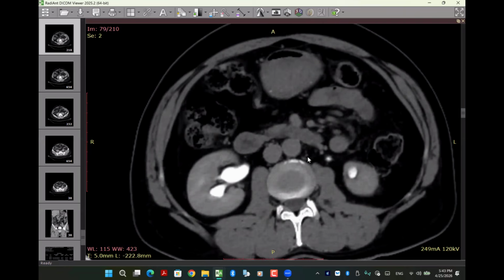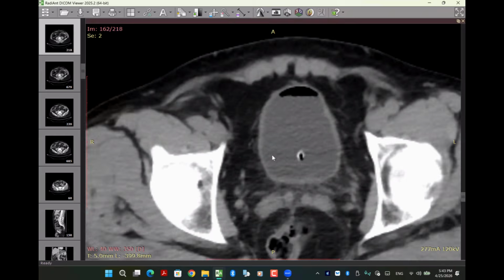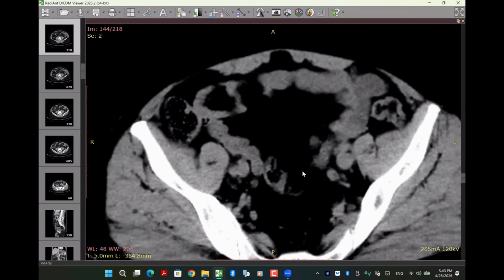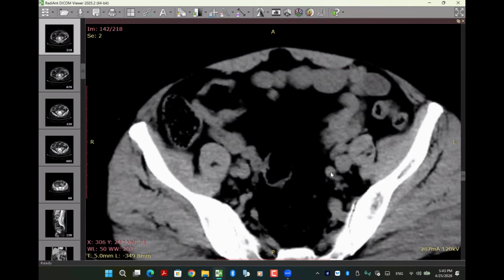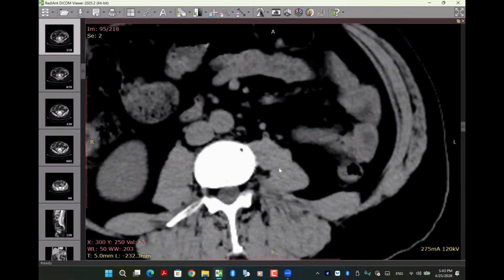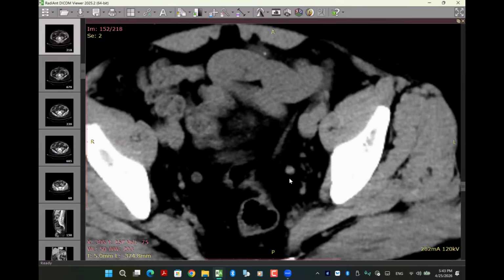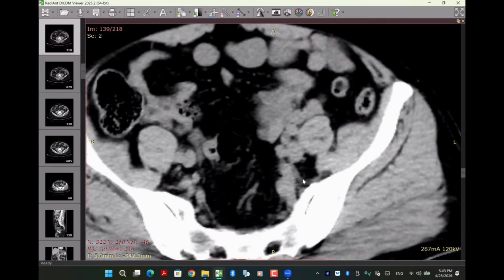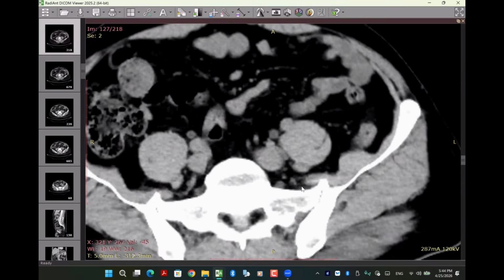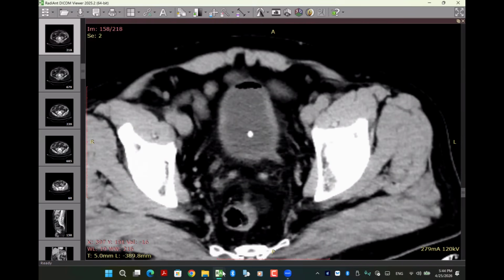Okay? You did very well, but it was a tough case, because we can already appreciate this, though I know there is lagging on the internet. If you harden the image or do extended focus, see, it was already there on the non-contrast. You got my point? So if you have a case of hematuria and you didn't find any obvious or obstructing stone inside the course of the ureter, remember to search for a filling defect, like a mass lesion, or even something simpler, ureteric hematoma from passage of a previous stone. You got my point?